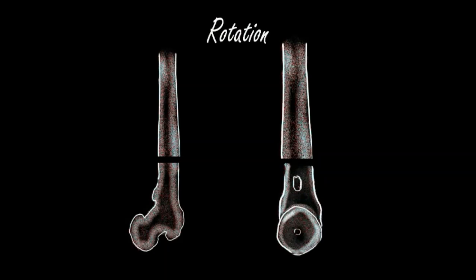It may be that not only do you have a fracture, you may have a rotation of the distal fragment. Here's an example where the distal fragment, although it was initially like this, I've depicted it here where it's actually rotated from here to there, in the sense that it was initially like that. I hope you get what I'm trying to show here. Having now been through the various ways of describing a fracture, we'll look at a real-life X-ray of a patient with a fracture, and we will present it with the technique we've just learned.